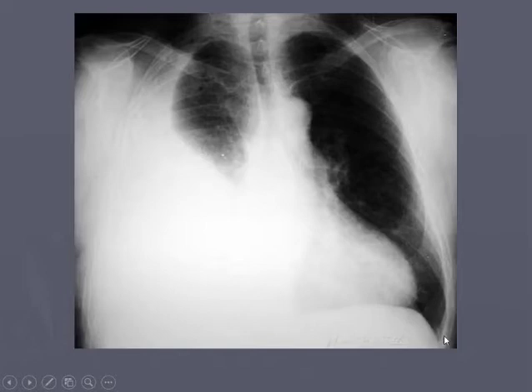Diaphragm, I can see a diaphragm over here. Can't see a diaphragm at all over here. This is all just one big mass. E, for everything else, I don't see any markers. And then F, again, you can see that over here there's no diaphragm. It's just all dense white stuff, and this is fluid, just all encapsulating that left chest, or the right chest, excuse me. So this was what we would term a large pleural effusion.